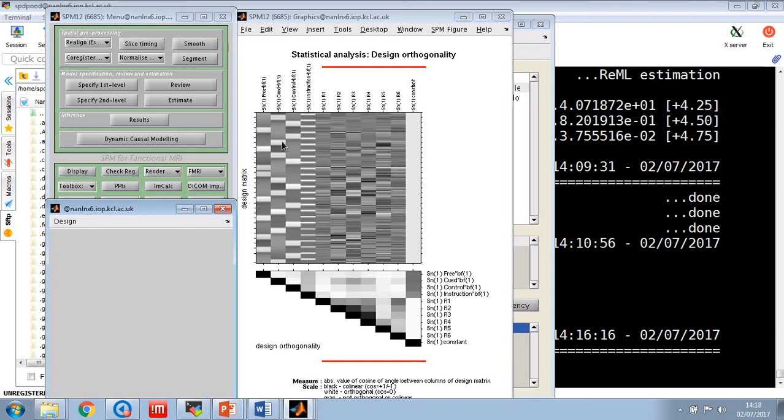You can see here on these blocks there tends to be some motion happening when this condition is happening. Not so much at that point, but here the motion seems to be a little bit correlated with this condition, particularly in this axis here. You can see it. Not only there, but particularly. So that's probably this condition here.